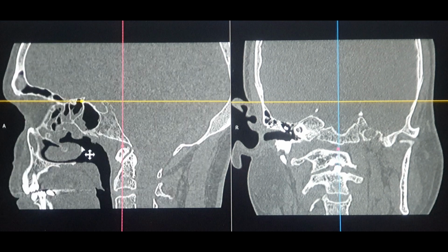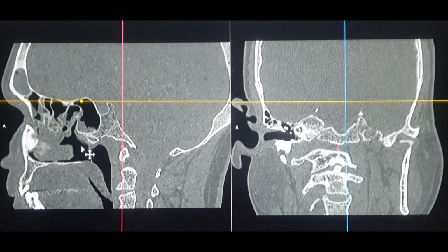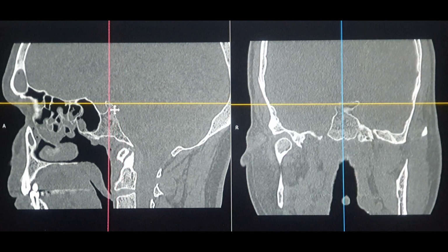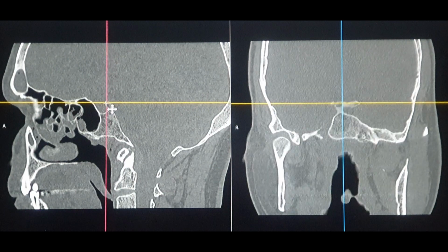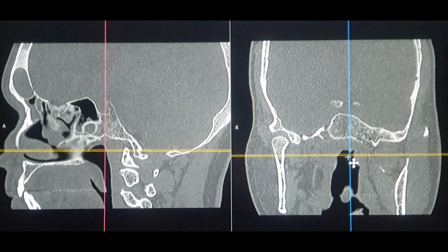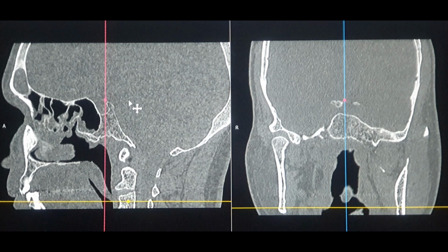Okay, so I hope the concept of the sagittal scan is very much clear for you guys right now, or the frontal sinus anatomy, the anterior, the posterior ethmoids, the ground lamella, the sphenoid, the pituitary, the processes. Okay, so this is how you can actually study the area. This should be the area of the posterior clinoid process somehow, because that is posterior to the sella turcica around here. So that's the area of the choana for you guys. As I said, that's the nasopharynx, and that's the oropharynx around here. I think that's it. So I hope the sagittal scan basic anatomy is very much clear for you right now.